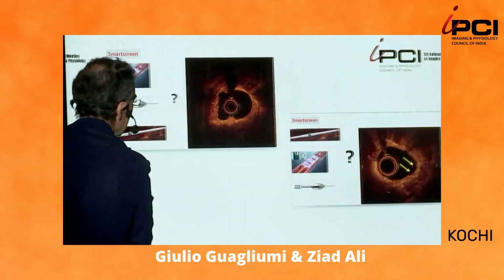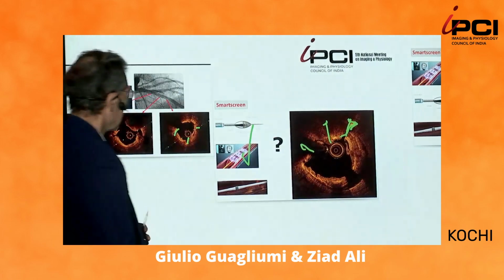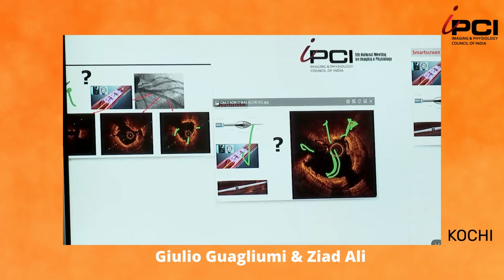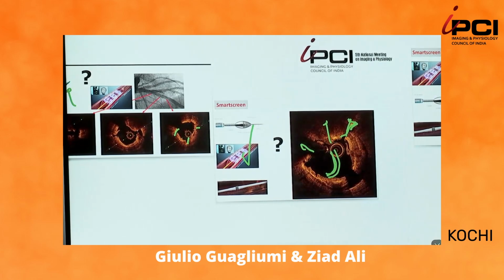The other trick, by the way, is, let's go back one slide. The other thing that I'm looking for is a smooth, rounded surface anywhere that was modified by either orbital atherectomy or rotational atherectomy, which I can't see. And hence, my answer is B.